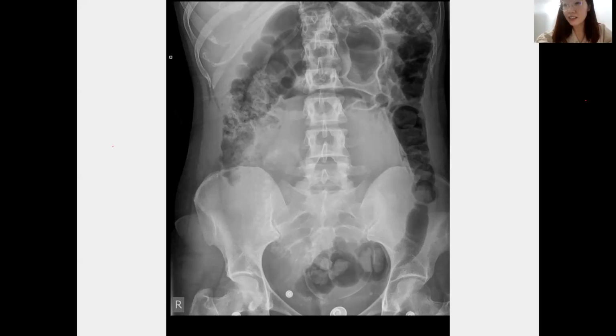Nobody. Really, nobody. Okay, come on, one more guess. Somebody must know. Okay, give us a hint. Hint: 18 years old female with acute abdomen. So female always have acute abdomen.